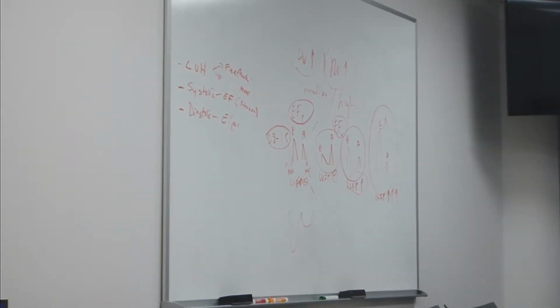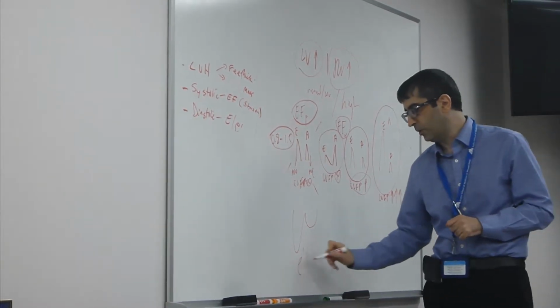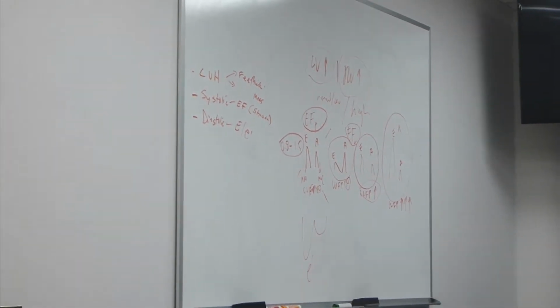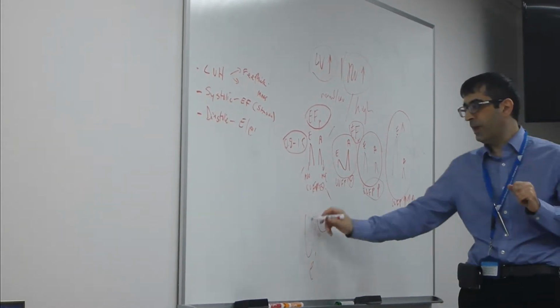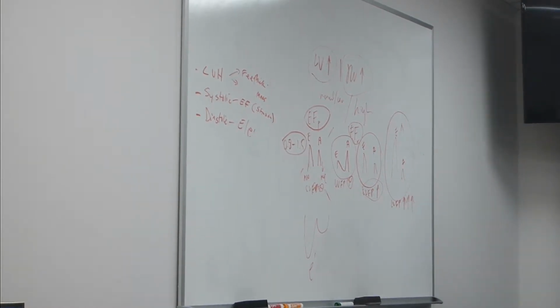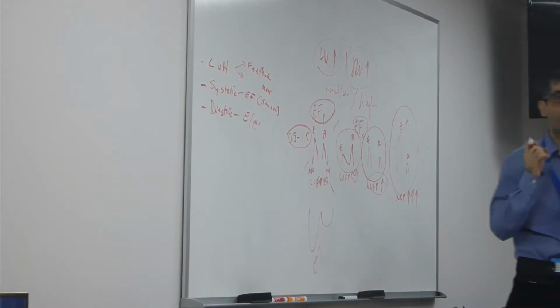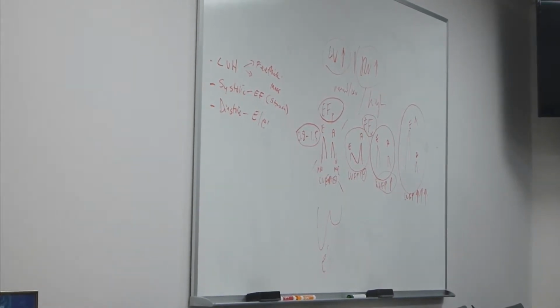So what you want to see is the relaxation, let's say the longitudinal relaxation, which we call the E prime. It occurs at the same time as the E velocity. It's the recoil of the myocardium right after the mitral valve opens. So the faster and the bigger the recoil, the healthier the myocardium. You want to see good recoil, because relaxation is an active process, and the faster the myocardium relaxes, the better the diastolic function.